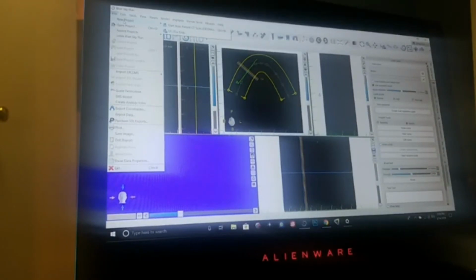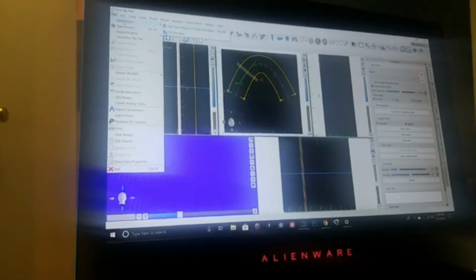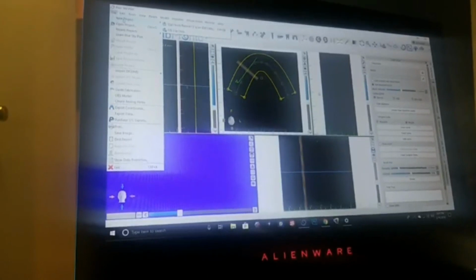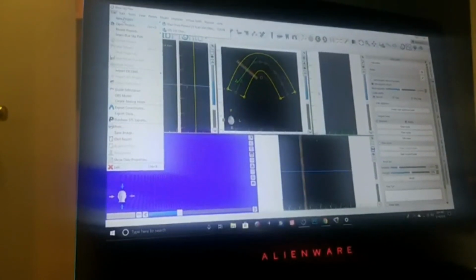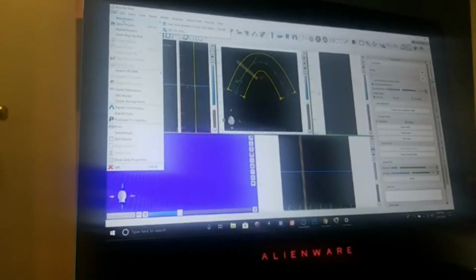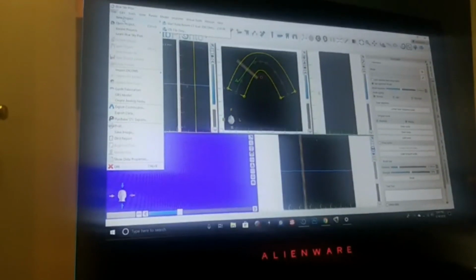Now, working with the program is another thing that you need to consider and learn. So if you're a beginner and you want to know about CT scans, you don't want to get too hung up on how he did this or what he did, because we will do more broadcasts in the future and try to go more into the details of how.